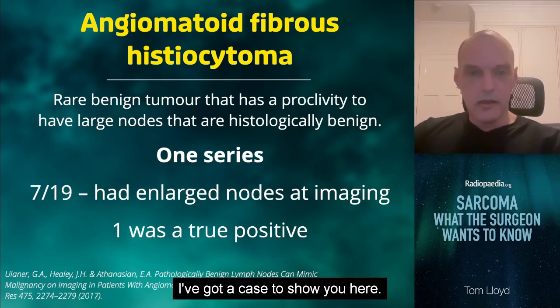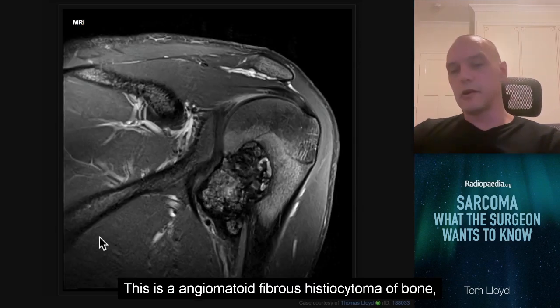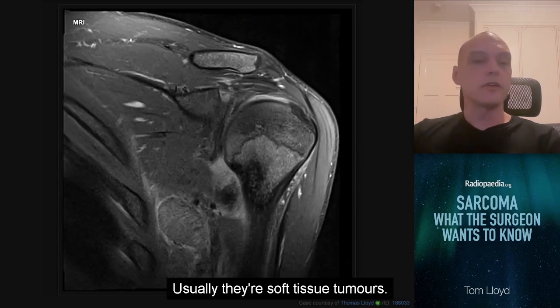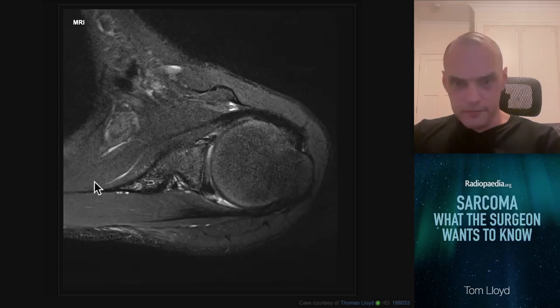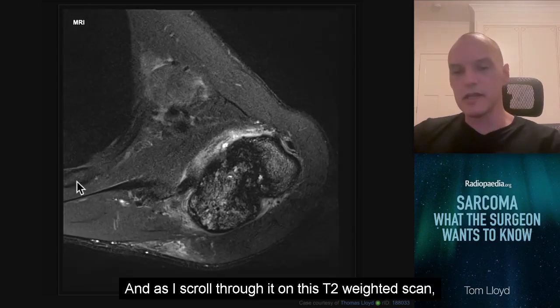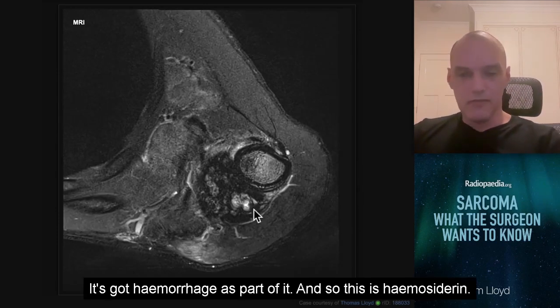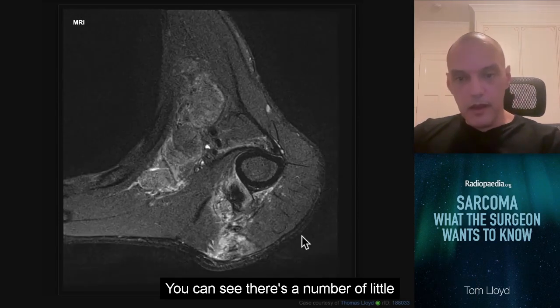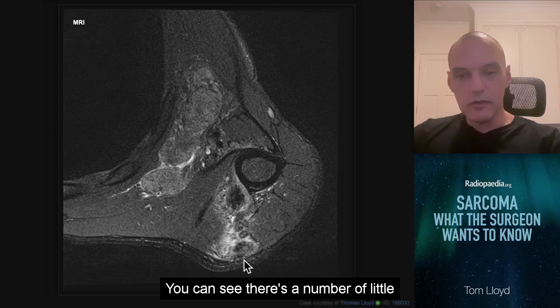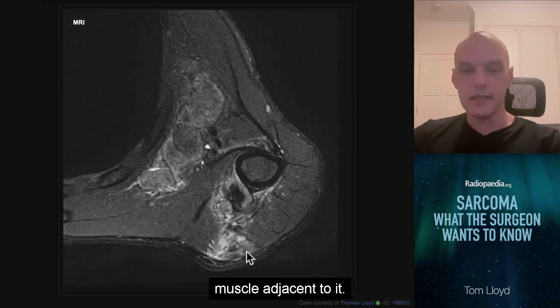I've got a case to show you here. This is an angiomatoid fibrous histiocytoma of bone, which is a little bit unusual. Usually they're soft tissue tumours. This one you can see it's involving the proximal humerus as well as the adjacent soft tissues. And as I scroll through it on this T2 weighted scan, you can see that it's a very dark tumour. It's got hemorrhage as part of it, and so this is hemosiderin. You can see there's a number of little similar looking tumour deposits in the posterior deltoid muscle adjacent to it.